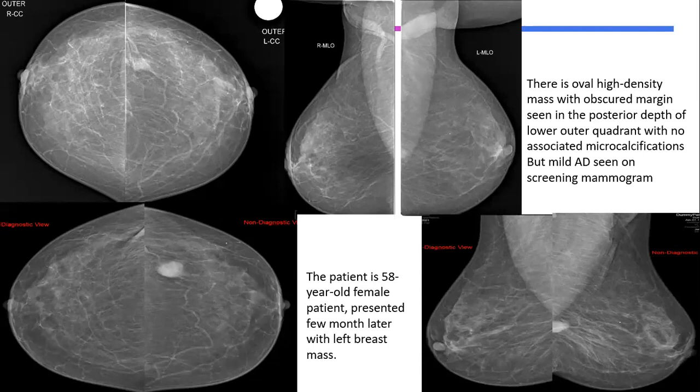Why? Because at the beginning, that was screening. This was a screening mammography, and it was reported as a single area of asymmetry. They could not appreciate the subtle correlate or corresponding area projecting over the pectoralis on the MLO. Usually a single view, faint, equal asymmetry is ignored on screening mammography. There were no other associated features.